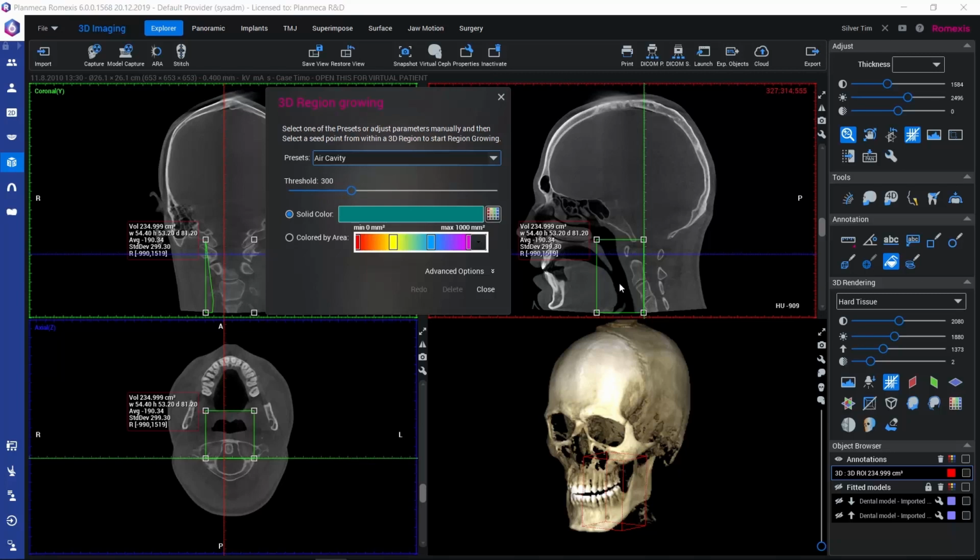Basically, if we hit somewhere on the border of the airway and the surrounding soft tissue, at a value that is minus 500 something, that's where the segmentation knows to stop. And also the borders of this cube work as borders for the segmentation, so it will also stop there. That's why we needed to enclose the anatomy inside this cube. So these borders will stop the segmentation, as well as a big enough difference in the grayscale values.